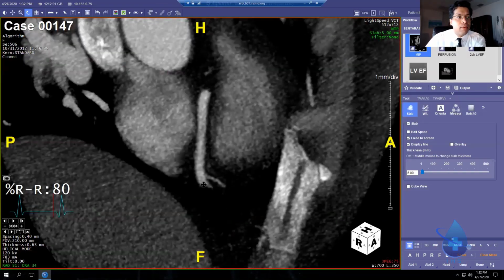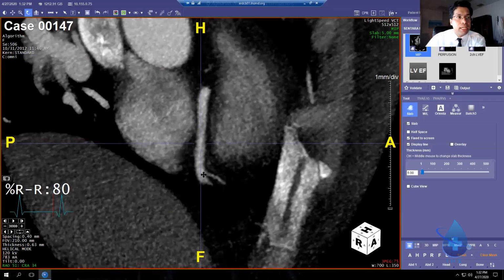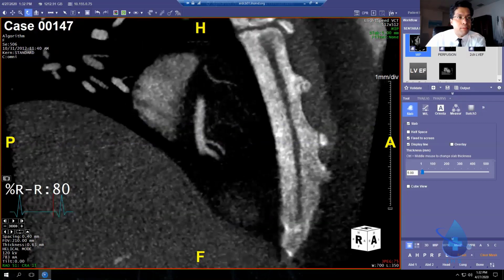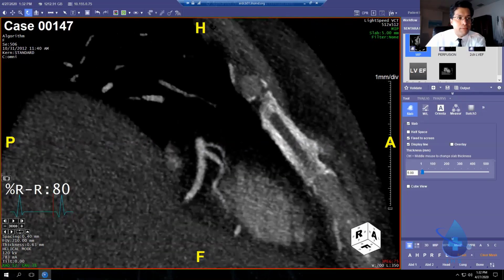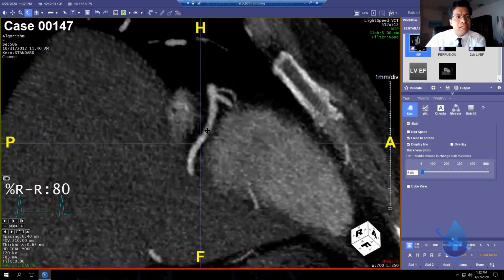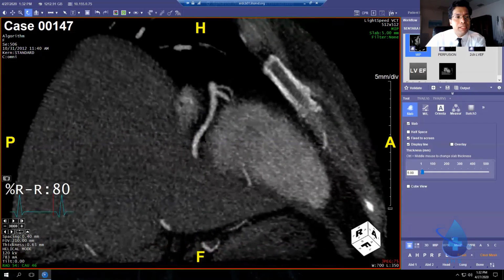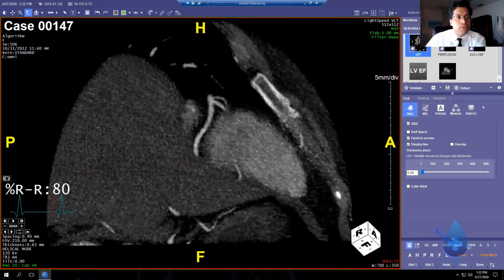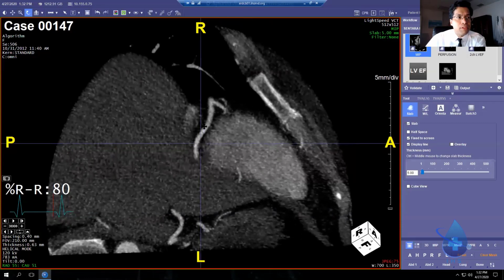Now I'll right click on the distal portion that I can see and pan it to the center. And then left click and rotate straight up to bring more of the distal into view. Here's where people start to get a little bit lost, mostly because they're not used to this view in the cath lab. But you keep that groove lined up north and south.